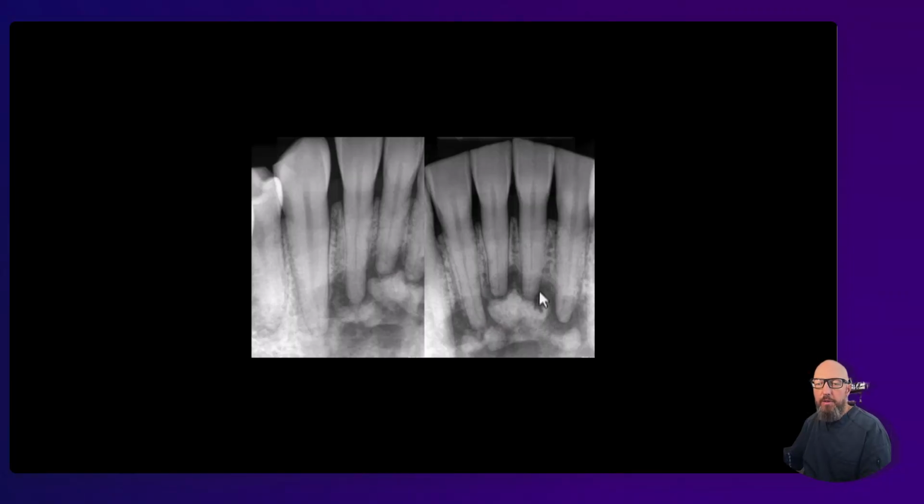Typically with a periapical inflammatory lesion, only radiolucency right at the apices, and then it's surrounded by the sclerotic bone that usually has more of a gradual, ill-defined border as it blends with the normal bone. Here, the radiolucency is going all the way around it. What does that tell you these are? It's the common location. So this is our periapical cemento-osseous dysplasia.